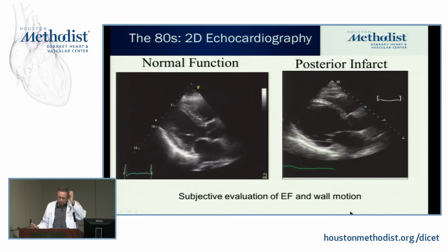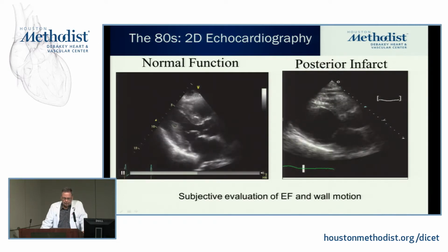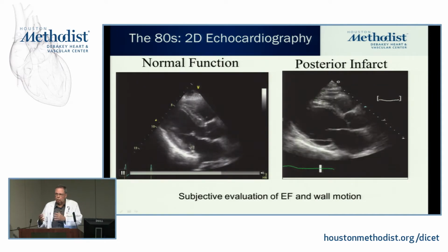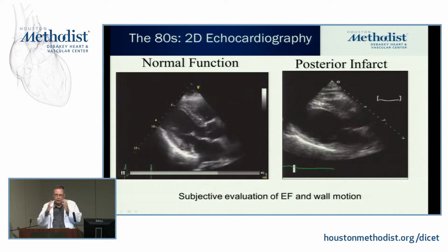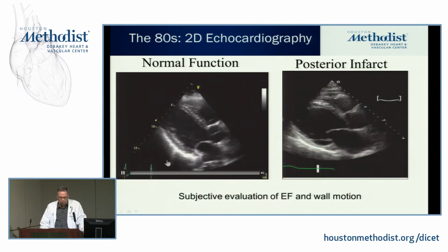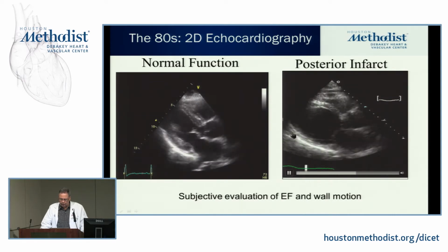So when we look at left ventricular function, many of us first do a subjective assessment of it. And as we do that, we learn to appreciate the percent shortening of the cavity that we're looking at in multiple views, as well as the percent shortening of multiple diameters as we go across, which is a function of circumferential shortening. And at the extremes, we do very well. No one will have an issue saying that this is an absolutely normal ejection fraction and a relatively normal size heart. And we all would agree this is a big heart.